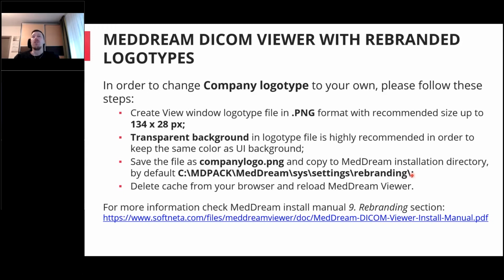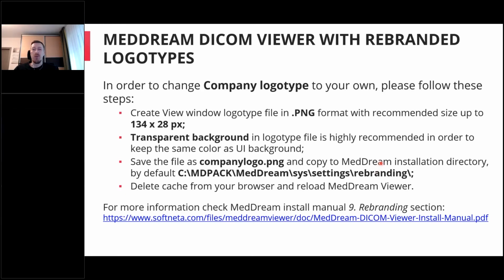By changing the logos in this way, you ensure that MedDream will work, and you can always replace the logo with the previous one, and there will be no breaks in the MedDream workflow.